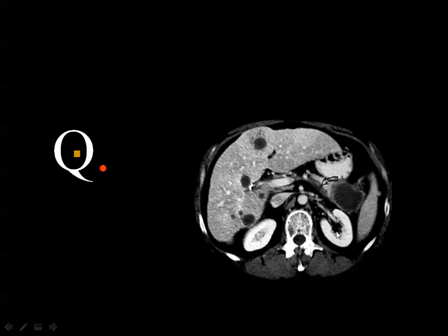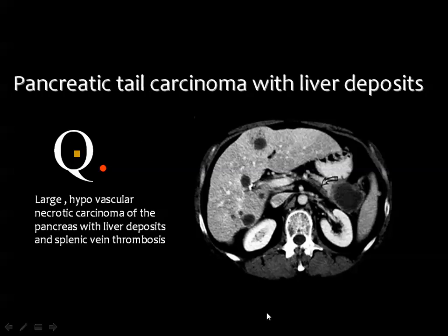Okay, this is a post-contrast CT scan of the abdomen after oral and intravenous contrast material. You see a cystic lesion in the tail of the pancreas, and you see multiple focal hepatic lesions. Then if the tumor is cystic, you expect that the metastases are cystic, and this is common in the ovary and in the pancreas. And you can see cystic neoplasm carcinoma, of course, in the tail of the pancreas with multiple cystic hepatic metastatic deposits. And this is not polycystic disease. Polycystic disease primarily affects the liver, the kidneys, to a lesser extent the spleen, and to a much lesser extent the pancreas.